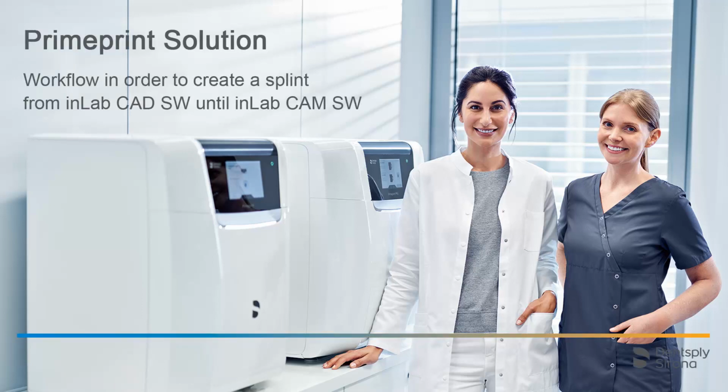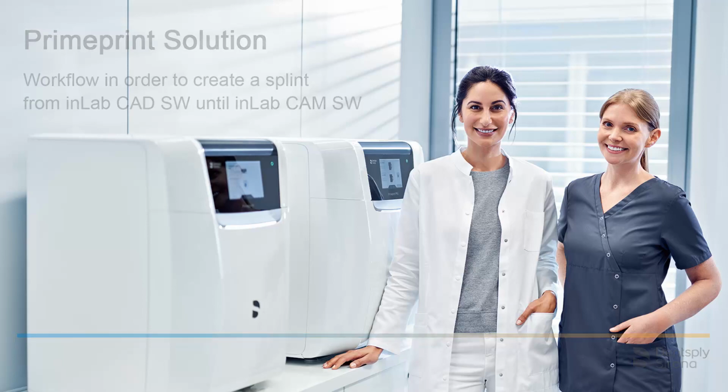Welcome to this video tutorial on the topic of Primeprint Solution. In this video, we will demonstrate the workflow in order to create a splint. We will guide you through the inLab CAD software and the inLab Splint app to the inLab CAM software.